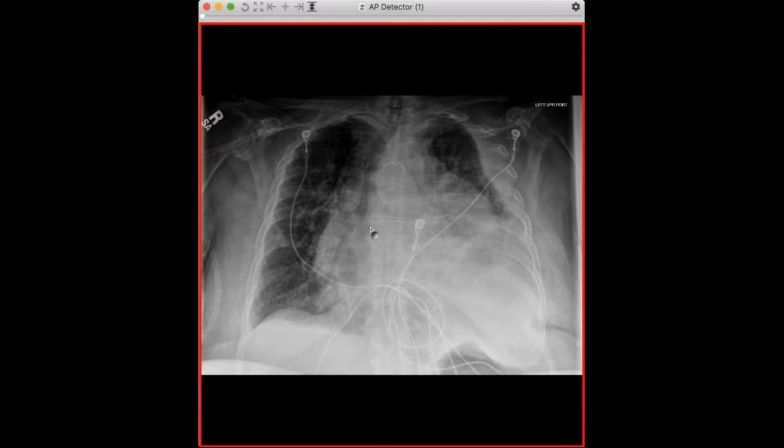So this isn't just a rotation. And the right heart border and the right interlobar pulmonary artery and hilar structures are also displaced. So even though we see this crescent here, there is clearly some space-occupying process, yet we still have some lobar atelectasis. So very concerned following a drain release that there's now a hemothorax, and there are some rib fractures and such.